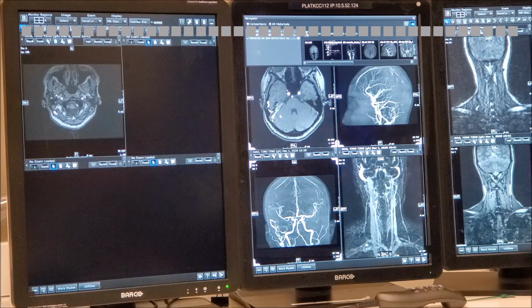But it doesn't look like a sinus, does it? In other words, it's not one tube, right? This is one tube. So you see multiple small channels. So you already know that this does look vascular, right? It's not like an infiltrating tumor, right? And then we have prominence of the sinus.